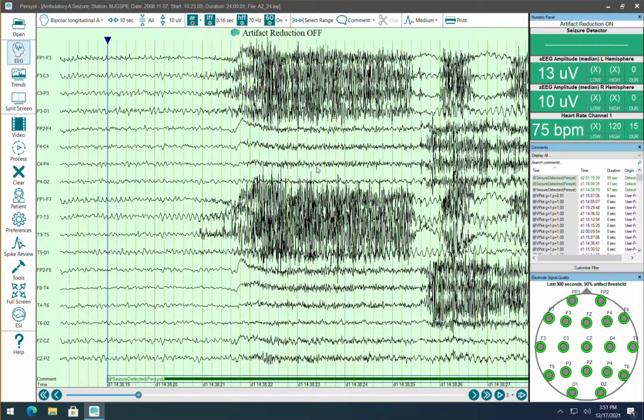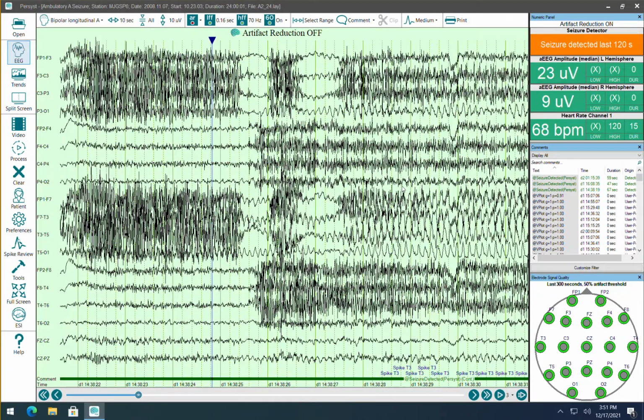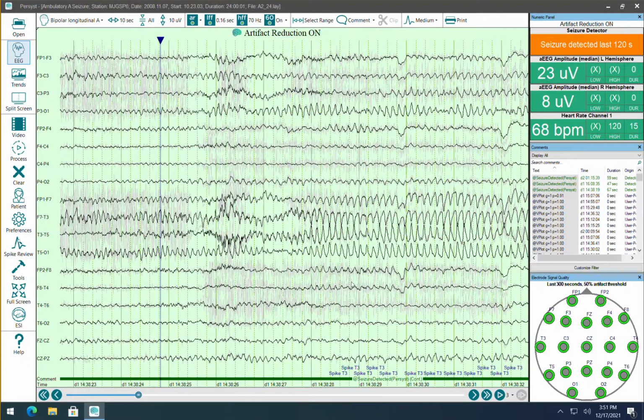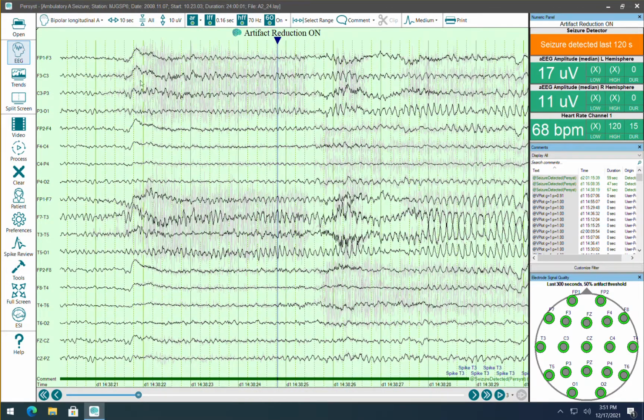And when I click the EEG page button, now we're looking at this, we see some muscle artifact. Of course, you can use a high-frequency filter, but applying an aggressive high-frequency filter will attenuate the EEG as well. It doesn't discriminate between EEG and artifact. Since that's undesirable, we can click the arrow button at the top and spatially separate the muscle artifact from the cerebral signal, in a sense seeing through the artifact, and we can see the seizure more clearly there. Now, we also render the original signal. We superimpose that. So you always see the original EEG when you're applying artifact reduction.